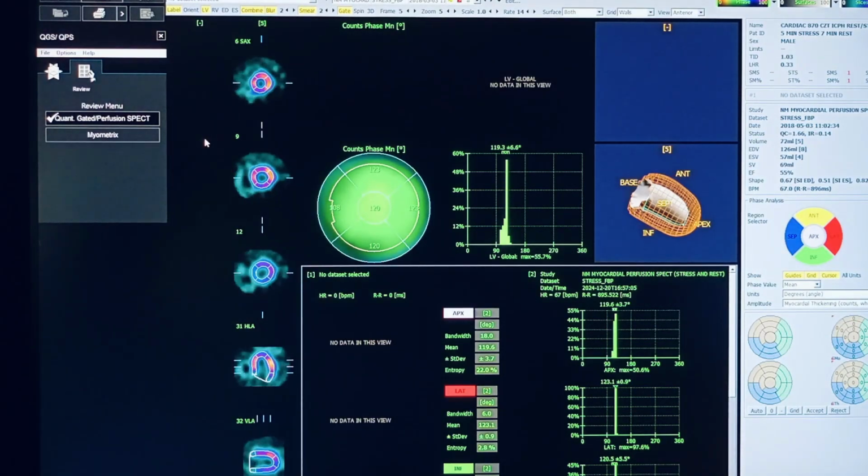This one is the phase analysis. So these options are there in the other toolbox also, but the only thing is the graphics and the color and the way it is projected is slightly different.